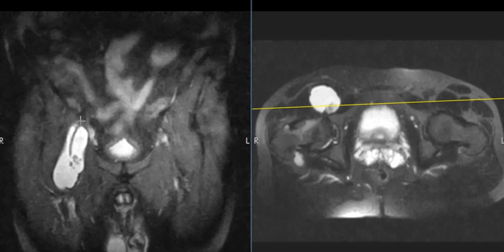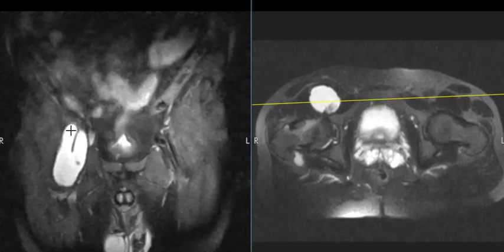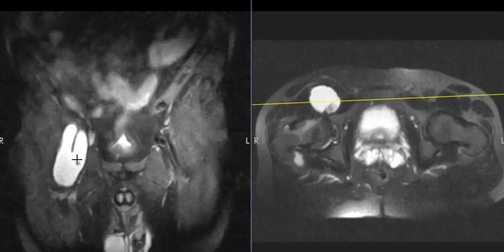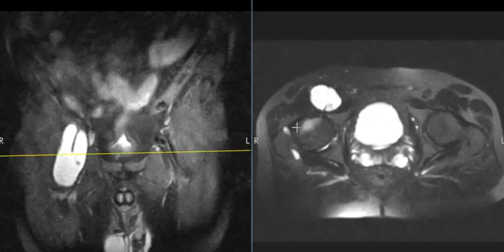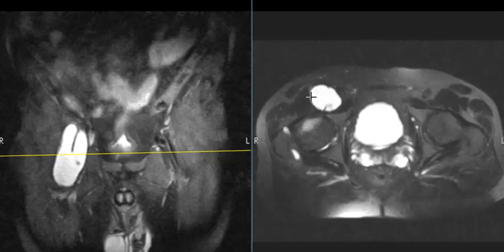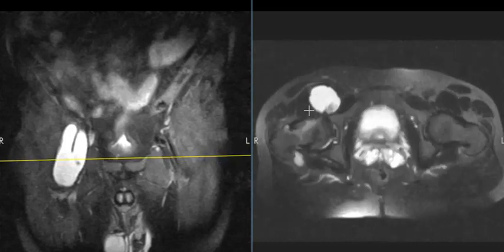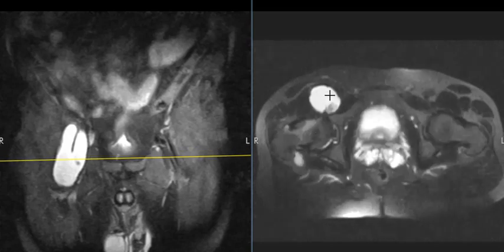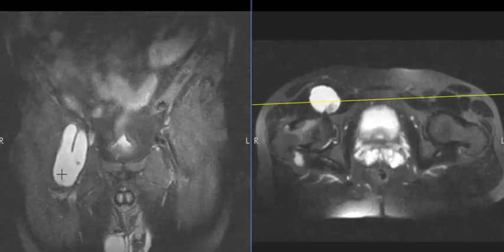And this is another view where fluid is bright. We can see this tubular, inflamed, enlarged bursa, some little nodular synovial inflammation within this. So, case of rip roaring Iliopsoas bursitis. And this can be associated with rheumatoid arthritis or osteoarthritis. In this case, the patient has osteoarthritis. Also, athletes who flex their hips can get rubbing of these muscles together, and this can become inflamed. But in this case, it may be related to this hip arthritis and ischiofemoral impingement, but a case of Iliopsoas bursitis.